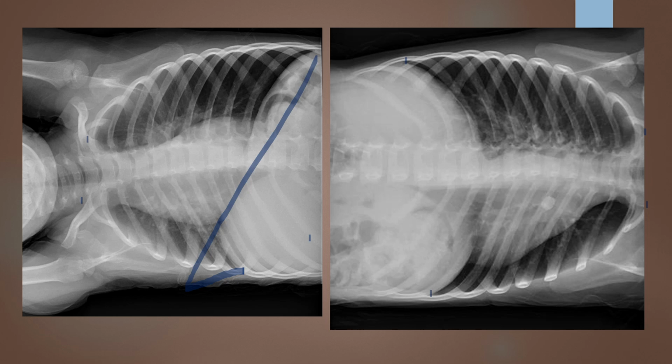I'm going to look for a letter marker on both of these, which is missing. I am going to look for the patient name, facility, date of birth, time, and date of exam, which we'll assume is there. And then I'm going to tell myself I probably need to repeat this exam because of the missing letter markers and then the clipped anatomy. So this one needs to be repeated for sure. But let's go ahead and keep looking.